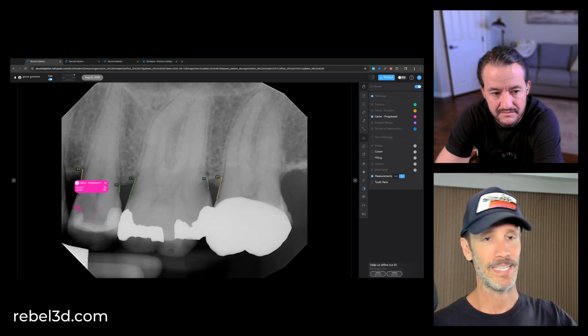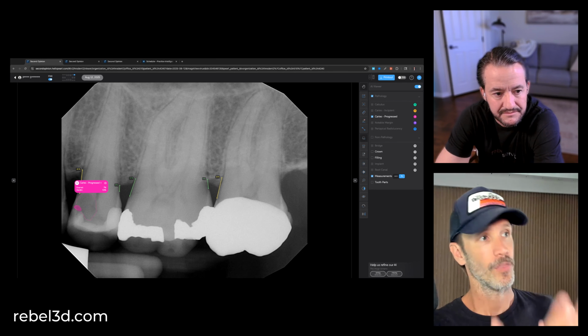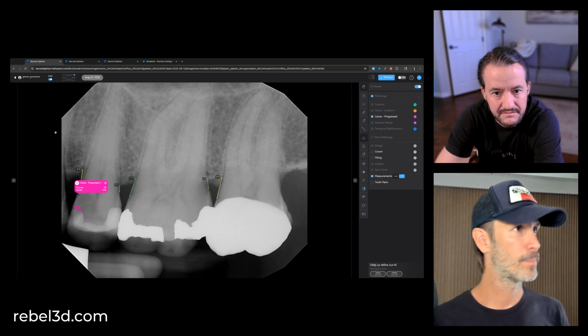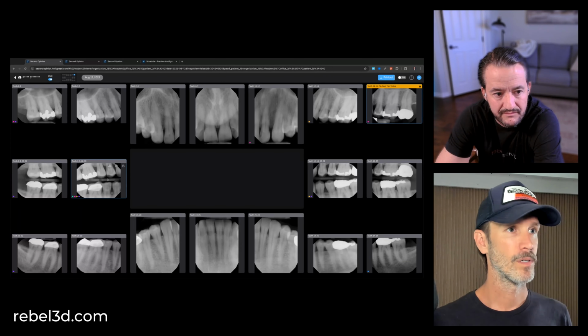Now, that's an easy one for doctors to see. And there's this small percentage that is in enamel as well. It's gone through the enamel. Another thing you'll see here, and this isn't really the best image to show for this. Let me see if I can find another one for you.